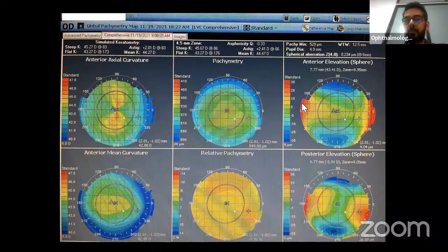Then anterior elevation, just a minute. Anterior elevation after spherical correction is suggestive of depression superiorly and inferiorly, and the horizontal part of the cornea is lying with the sphere, so it is matching the curvature of the sphere.